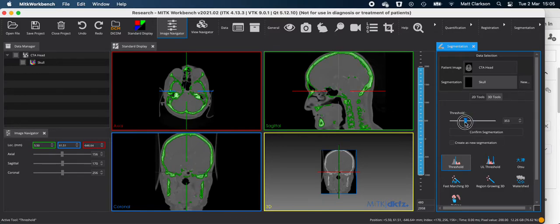If we look slightly more closely now, let's set a threshold value of, I don't know, let's go for 300. What this is doing is quite simply saying anything that is less than 300, we'll just call it background. Anything that is 300 or more, we'll call it segmented, or we will label it with a foreground label.